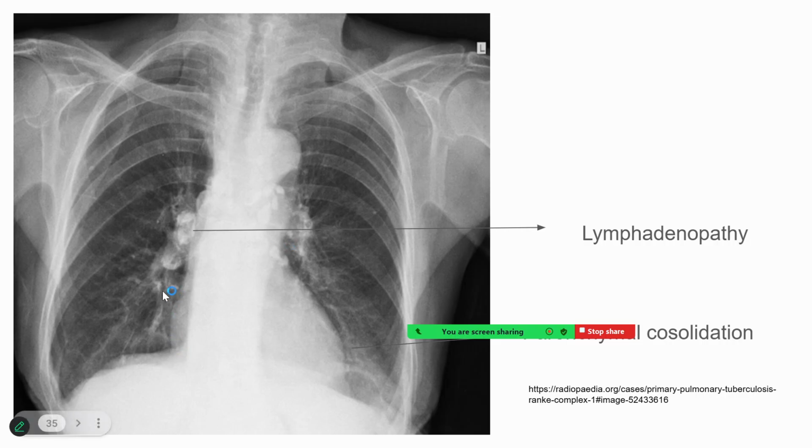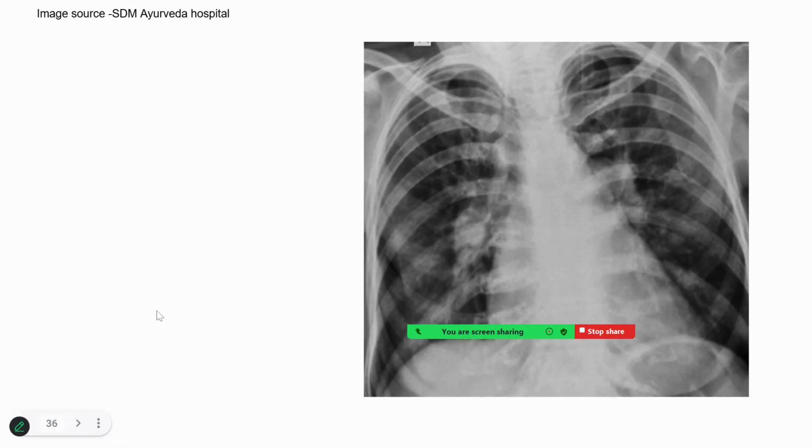Now, one more feature seen in primary lesions is patchy consolidations. Again, unlike a typical pneumonia, these consolidations would not have a typical pattern. The bronchovascular markings also would be thickened haphazardly, and hence you see lines which are not parallel to the ribs. Normal vascular markings are more or less parallel to the ribs, whereas these fibrous markings are haphazardly arranged due to the fibrotic changes which occur.